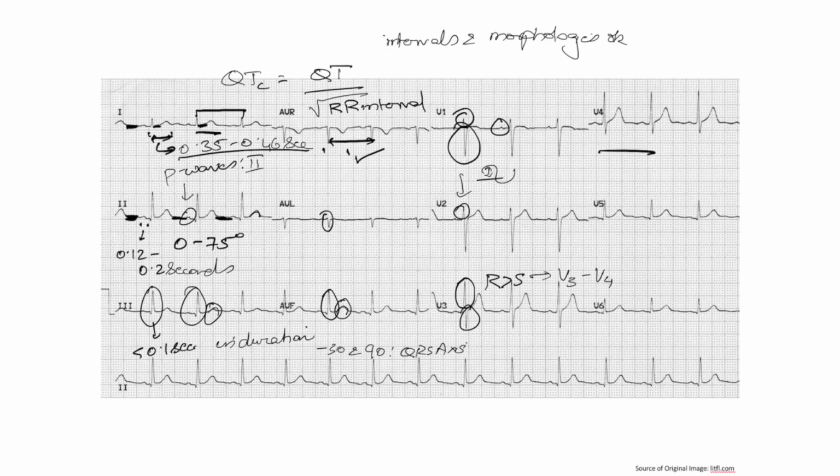Doing so consistently would give you a good grasp of what a normal EKG is, help you understand the variance of a normal EKG, and if you can pinpoint every single abnormality that you see on an EKG, that's a very good first step in terms of interpreting EKGs. Once you know all the abnormalities, it's pretty much a matter of coming up with the list of diagnoses that would best explain the abnormalities you're seeing.